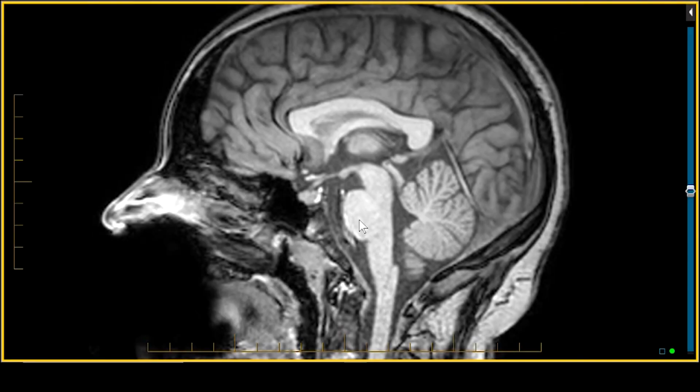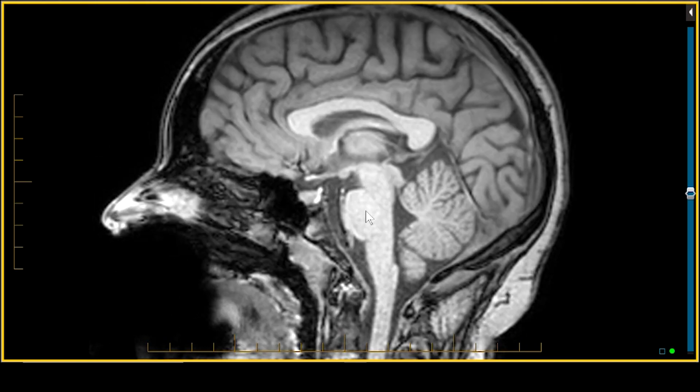Sagittal midline anatomy, focusing on the brain stem, the medulla separated from the pons by the pontomedullary sulcus. Another little sulcus can be seen at this protrusion here, which is a landmark known as the medullary clava, where the proprioceptive nuclei will synapse. Anteriorly in the medulla will be the location of the pyramids and the motor tracts. As we ascend, we reach the level of the pons with the pontine belly.